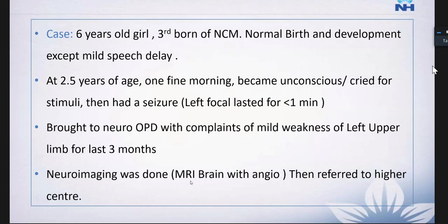So, criteria for the optic nerve thinning. Usually it is more of a qualitative assessment, but when you see in the intraorbital portion that the diameter of the optic nerve is less than 2 millimeters, then we can say it is optic nerve thinning. But you should only consider the optic nerve, and you should not measure the optic nerve sheath within it.